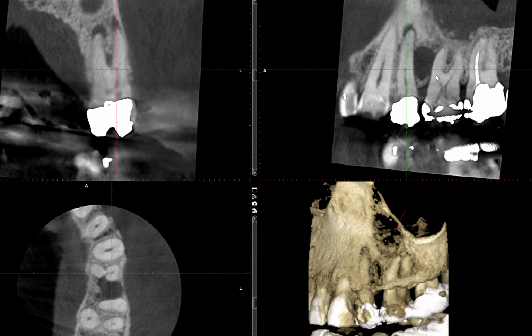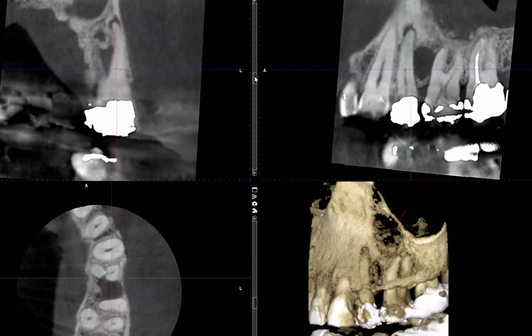So he wanted to confirm whether that is related to this premolar, the endodontic lesion, or perhaps this could be an unrelated, another type of condition that we should perhaps biopsy. So the endodontic evaluation was requested and we took a scan.